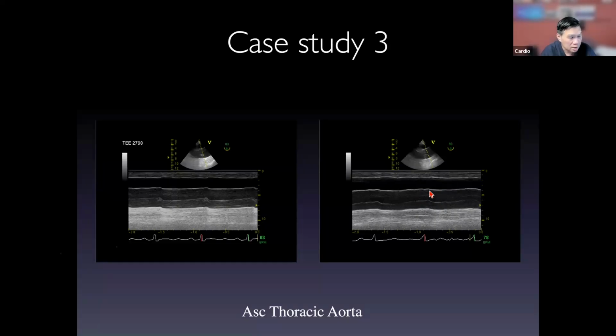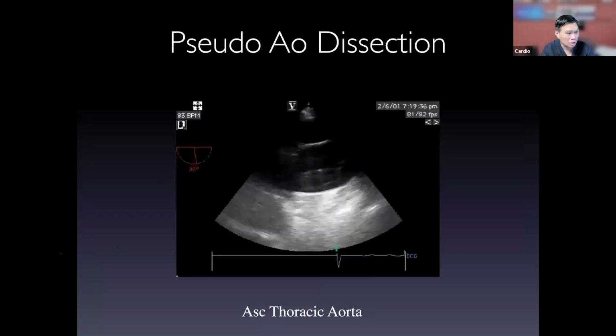So clearly there's likely a reflection artifact. Most likely what happened is that a chest wall structure gets reflected back onto the aorta, which acts as a mirror. When the mirror moves, the structure appears. That's why the structure gets mapped over here, and that's why there's a bump, there's a bump. So this is one of the useful methods of telling whether this is an artifact or not.